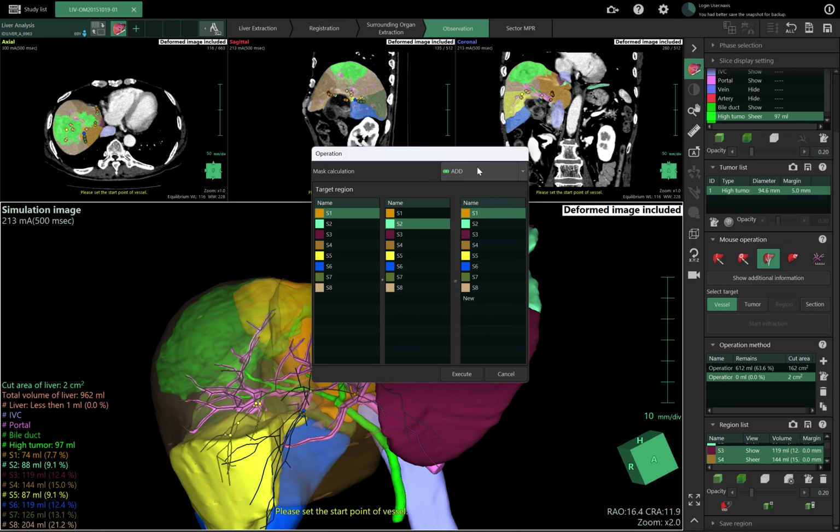Well, Boolean algebra is used mostly in mathematics and informatics, and allows you to have different regions and make some combinations. So I can have what is not in one area or the other, add what is in one area and the other, subtract one area from the other, the intersection of both areas, or what is not in the intersection of those areas. Okay, this is a bit complicated, but for advanced training, this is nothing I would show in a demonstration. But in advanced trainings, I do show them this.